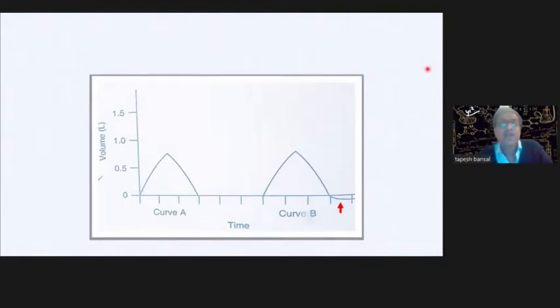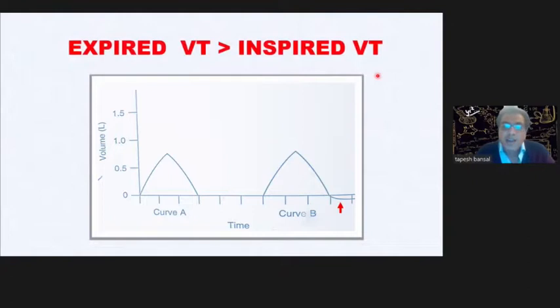Now, what is this? This is excessive volume being expired. Here, whatever volume was retained. So this is excessive expiratory tidal volume occurring here.